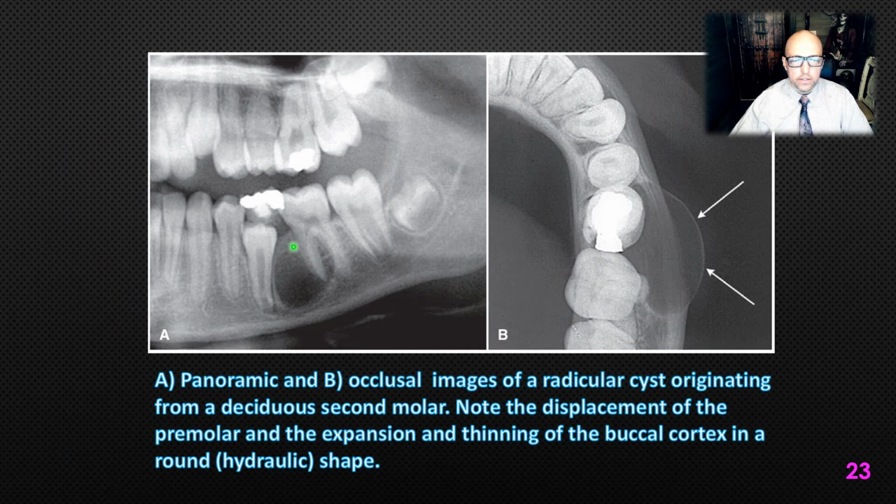Okay, these are the same patient, a panoramic and occlusal radiograph. This one really shows that raised periosteal or cortical border around it. I call it periosteal because it's expanding beyond the bone. It's expanding beyond the normal cortex, which is obviously right here. But it's maintaining this kind of cortical border around it. And so that's the periosteum laying down that calcification.